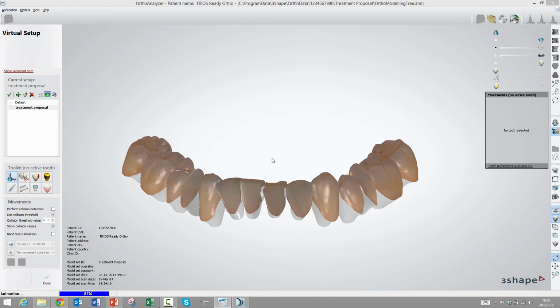And this video is saved into the folder of the patient in our Ortho data folder. Yeah, as a normal AVI file. Yes. So yeah, it's done now and it's saved.